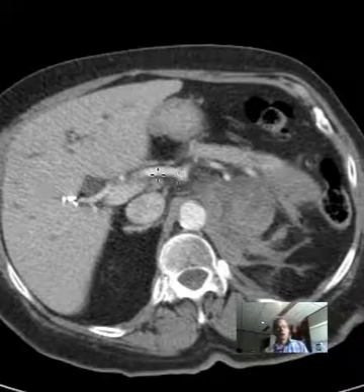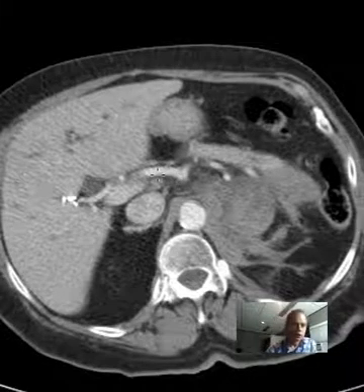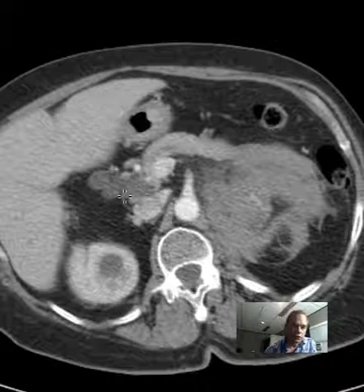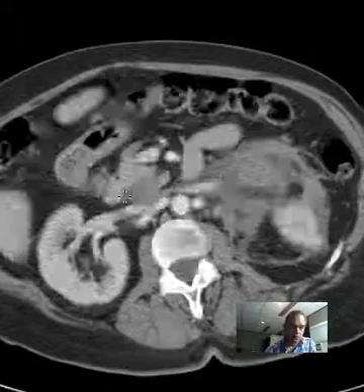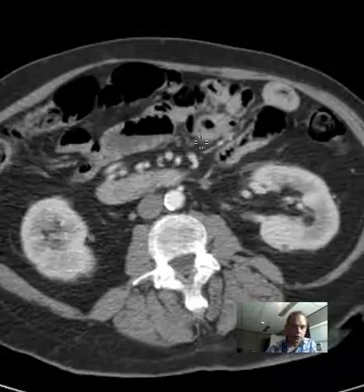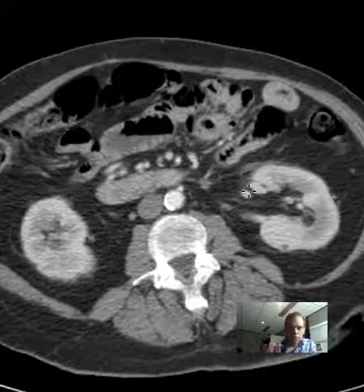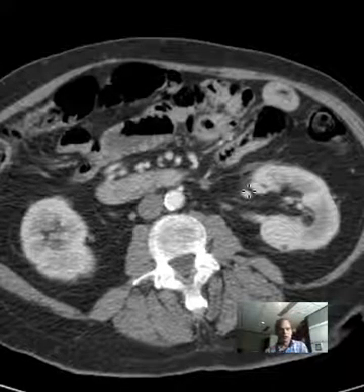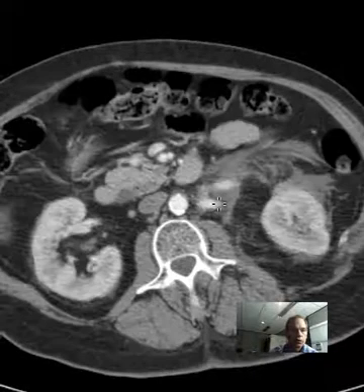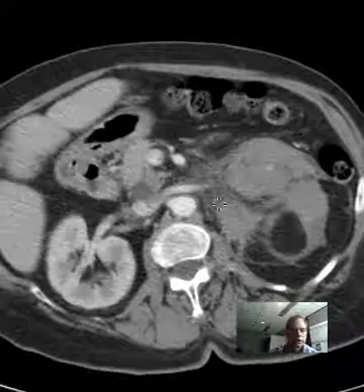So this is the hepatic artery. That's one thing that goes to the liver. What else goes there? Well, the portal vein has to go there. Where is it coming from? From the mesentery and the bowel. So if we go out to the bowel here in the mesentery, and you see all this mess, and you don't know what to make of it because it just looks like all these lines and squiggles and stuff, go back upward to the root of the mesentery.